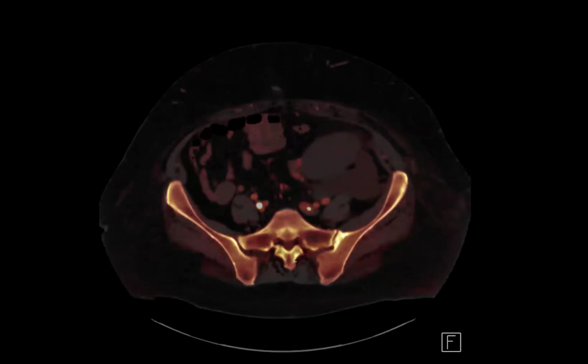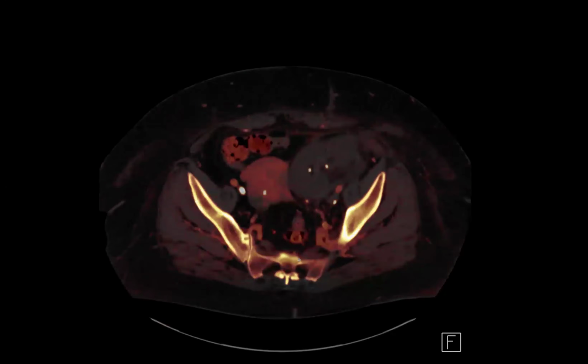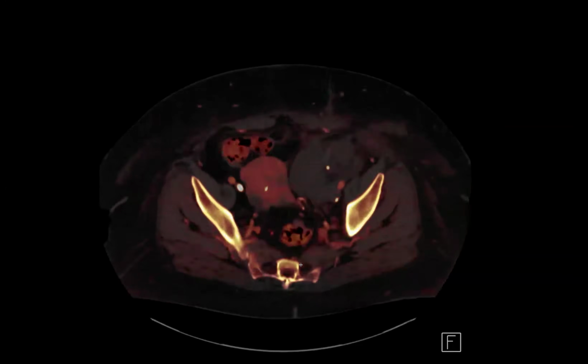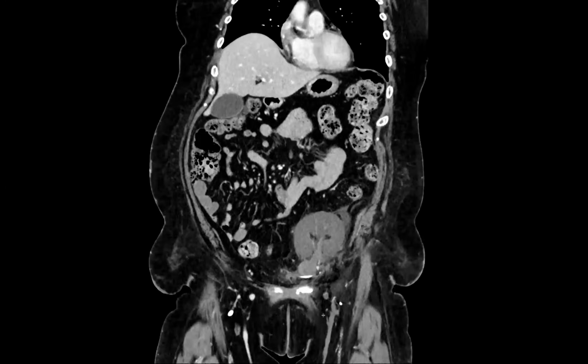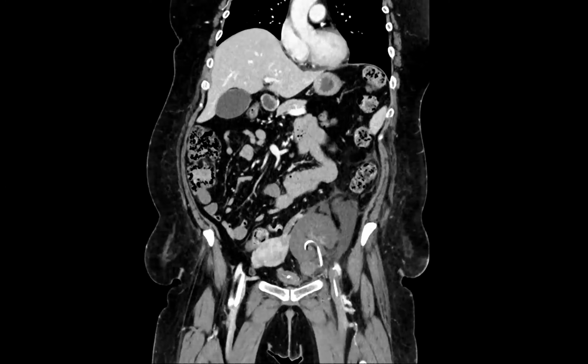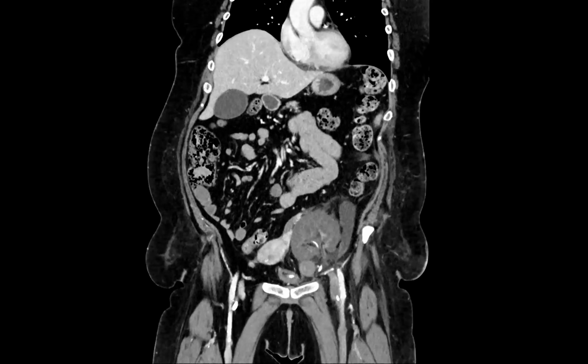They took the patient to the OR, and the allograft kidney was completely ischemic, and so they ended up doing a nephrectomy for renal vein thrombus. This was completely thrombosed. An interesting finding shown nicely here: renal vein thrombosis on Doppler is a reversal of diastolic flow. Was Doppler done on this patient? Yes, it was, and that suspicion was raised on the ultrasound.